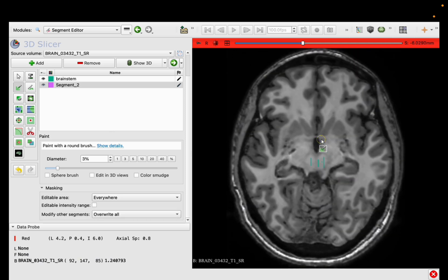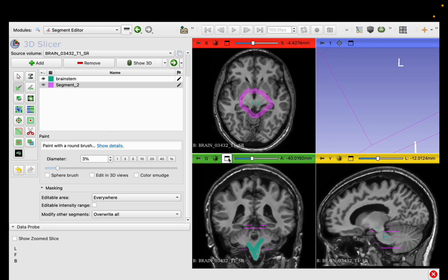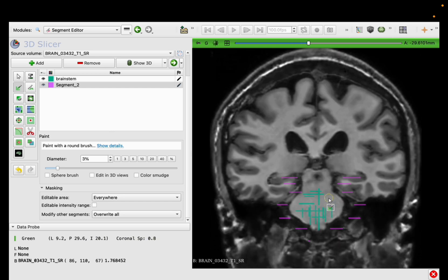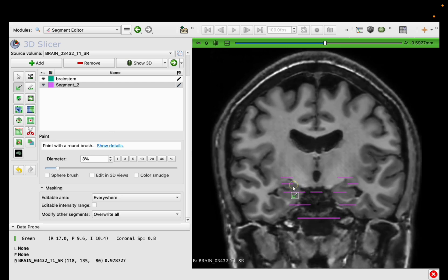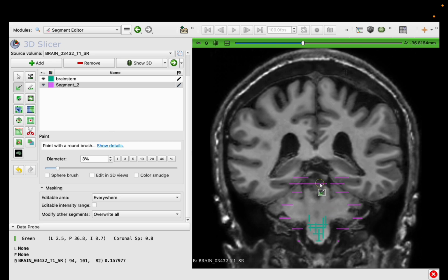times of doing this. Brainstem is mostly visualized on the sagittal view, but I keep doing this on all 3 dimensions. Again, make sure that your line is continuous and is closed. It will make your results more precise.